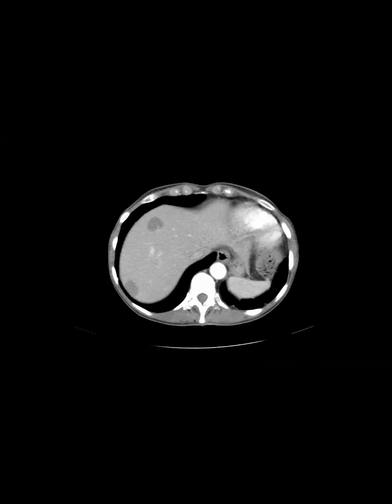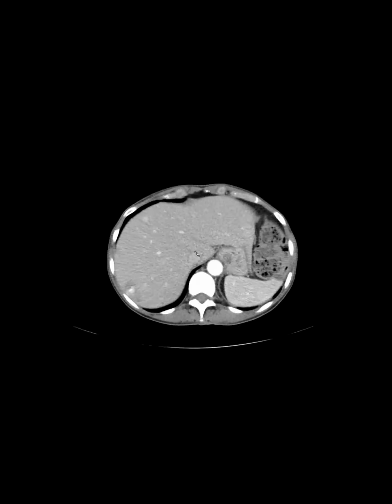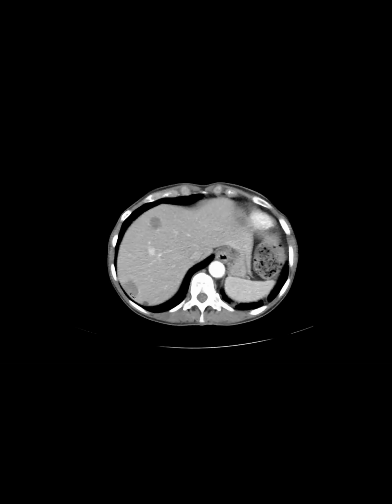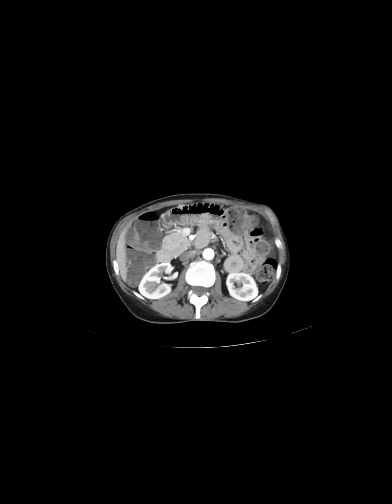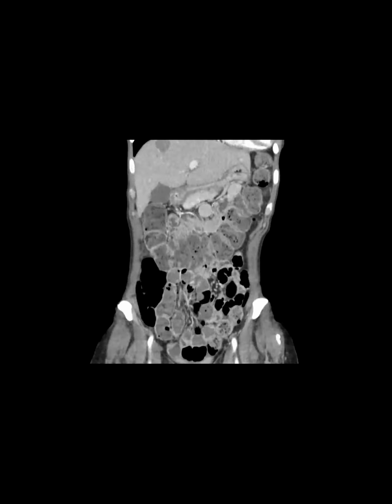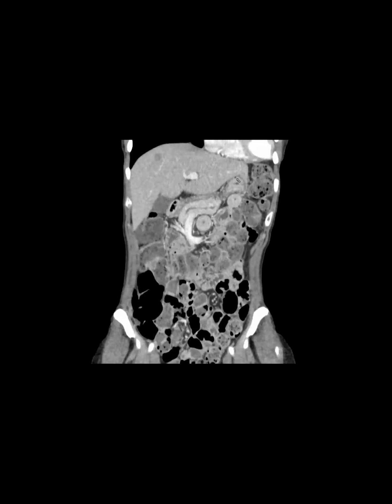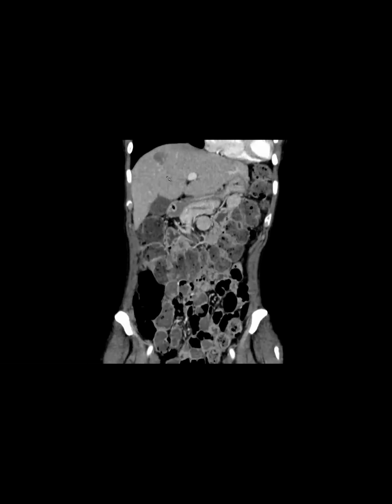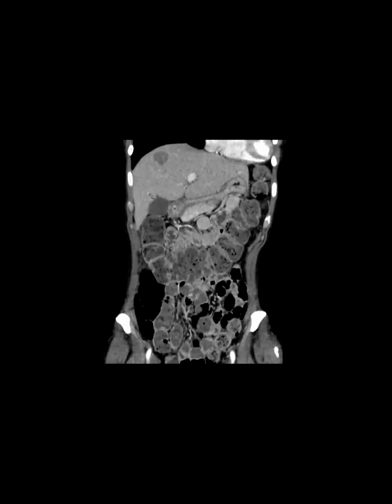Okay, this is my next one. What do you guys think about these liver lesions? I'll show you the coronal too. So there's an enhancing one here. There's this one here with nodular enhancement. There's that one there. There's another one here. The patient has a history of lung cancer, so we're reading a lung cancer malignancy screening. So there's this one, maybe some dots of enhancement.